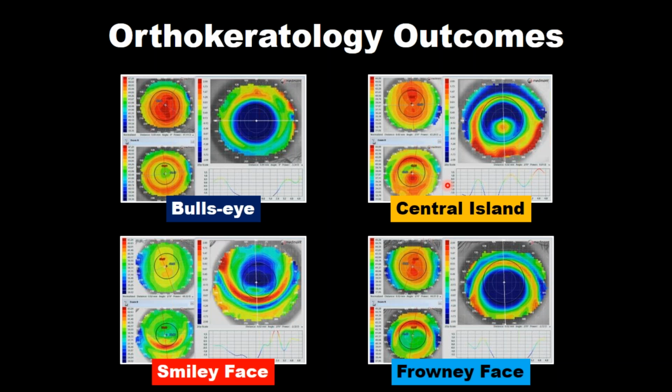Talk to the manufacturer of your topographer. Determine how to pull up a subtractive map. It is the most important function post-treatment that your topographer provides you. You absolutely want it and need it in your analysis of eye shape post-treatment, post-wear of your CRT lenses. It'll tell you when you've got that optimal bullseye.